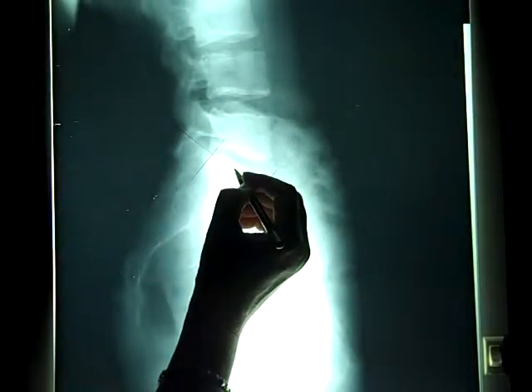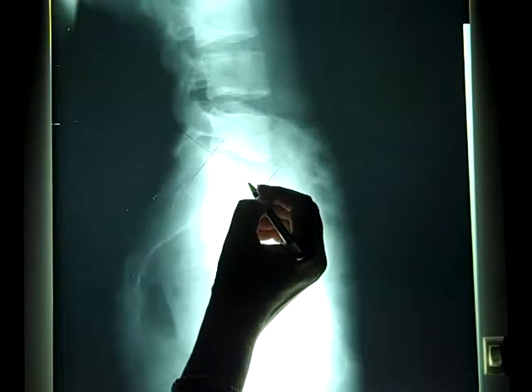Most people can do that by just eyeing it. If you can't, I suggest that you measure it, but you just simply divide it into 4 equal sections. You are looking at the inferior posterior aspect of the last vertebral body. And normally it should be lined up with this point right here. So this one is actually a little bit behind this point. So this one would be called a retrolisthesis.